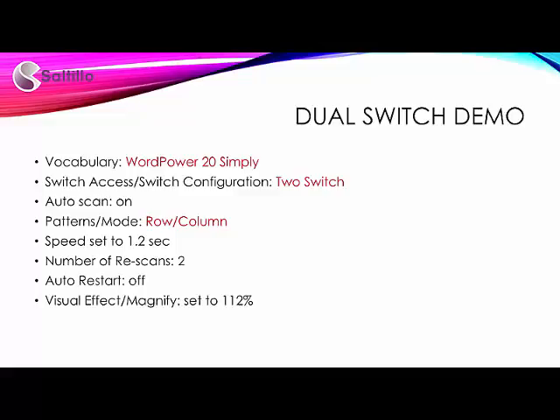This demo will use WordPower 20 simply with two switches in a row-column pattern. I can use the switch to wake up the device, or on the Chat Fusion I can touch the screen to wake it up.